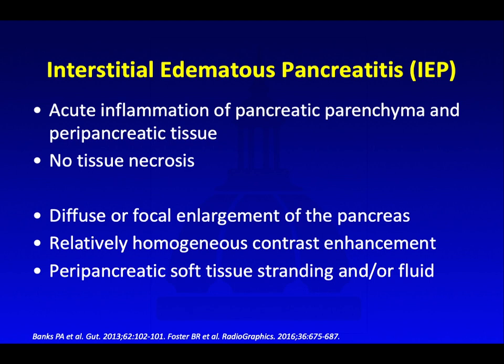So this refers to acute inflammation of pancreatic parenchyma and peripancreatic tissue, and there is no tissue necrosis associated with it. So on imaging, we expect to see diffuse or focal enlargement of the pancreas, relatively homogeneous contrast enhancement, and we'll see some peripancreatic soft tissue stranding and/or fluid.